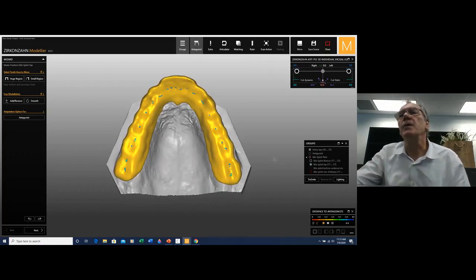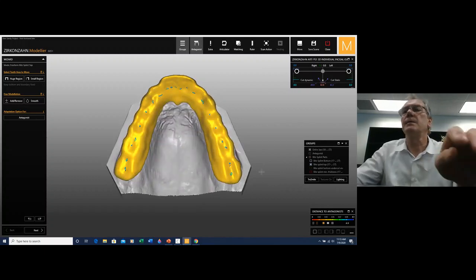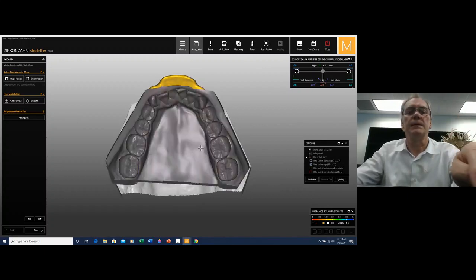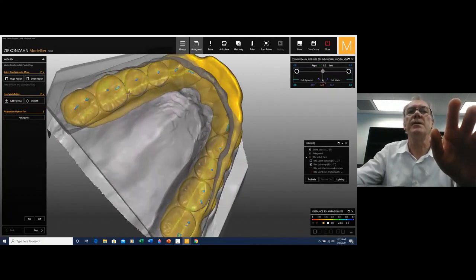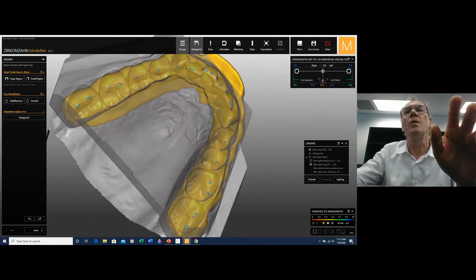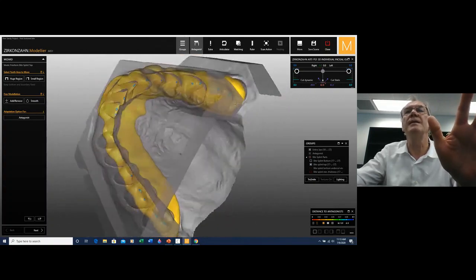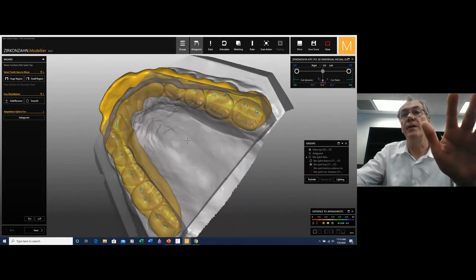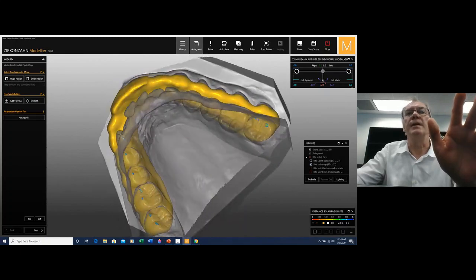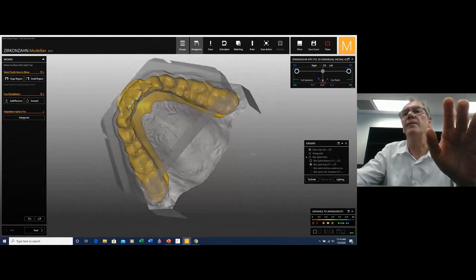First of all, your stop centrics need to be all in position. This is fundamental. Just let me make this translucent so we can see them. This is what I'm looking for. My stop centrics of my lower teeth are all hitting completely on my plane of occlusion. They need to be very, very well balanced. And these are the only contacts that I would like in the posterior region. What relates to the anterior region, I will set a contact more or less on every single tooth.